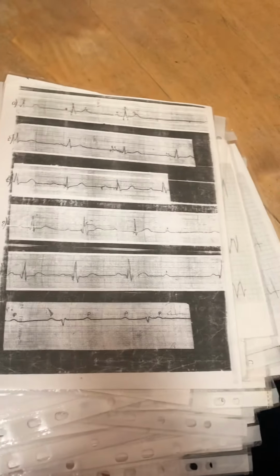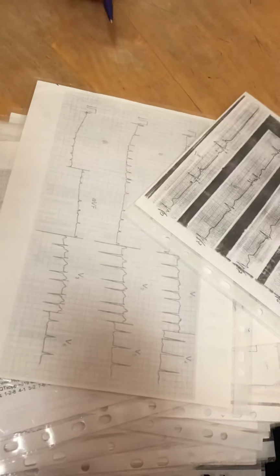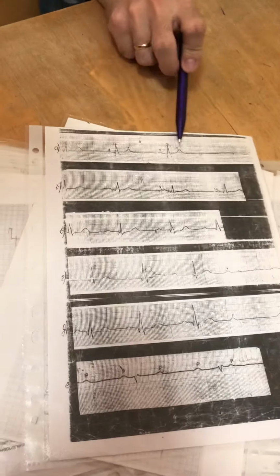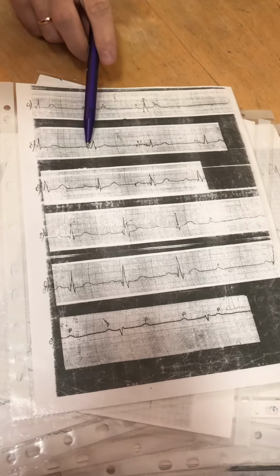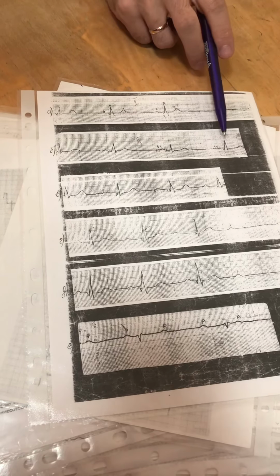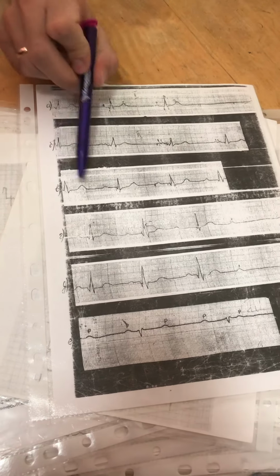And ECG with all blocks, if you need to know. First one, disappearance of PQRS complex, SA block. Second one, M-like shape of the P wave, it is an intra-atrial block, you don't need it.